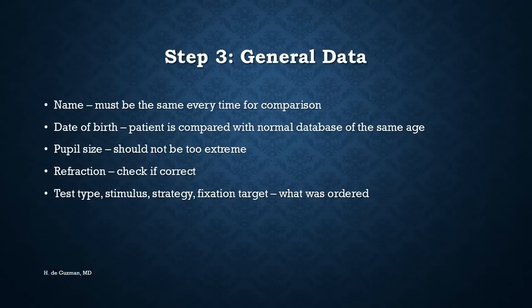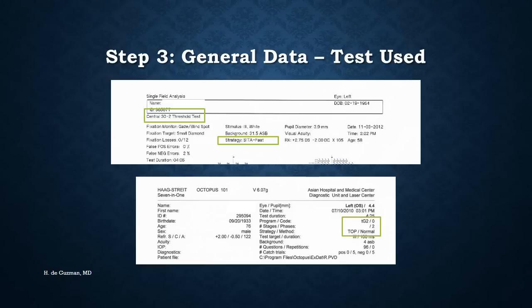The refraction should be the correct one used, or else you could get artifacts because of that. And make sure that the test type, stimulus strategy, and fixation target are what you wanted. So this is where you can find the test used.